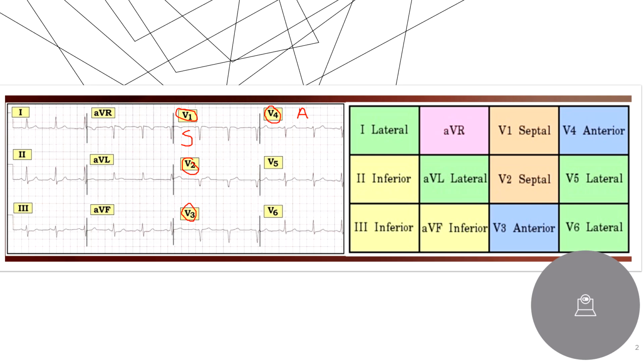And then we can go into lateral. The first one you should look at is V5 and V6, and that is actually low lateral, more towards the apex. If you were to draw the heart here and put, for example, the left coronary artery, and I'm not going to differentiate between the circumflex or the LAD, but we're looking at the left side here, V5 and V6 would be down here. This would be a low lateral.